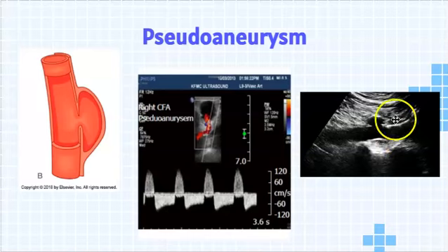They may give you this image and try to trick you into thinking it's saccular because it doesn't have that super thin, long neck or stalk. It's more of a short, stocky neck. And so they may ask you, is this a saccular aneurysm or is this a false or pseudoaneurysm? And the answer would be pseudoaneurysm because it doesn't have that little focal outpouching. It's more of a neck and then your little aneurysm, if that makes sense.